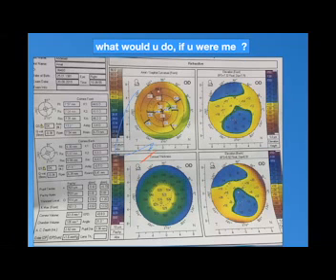If you remember, I said at the start, correlate the anterior elevation with the posterior elevation. If they are both high, consider it. If they are not, don't consider it, and think of another reason for that.